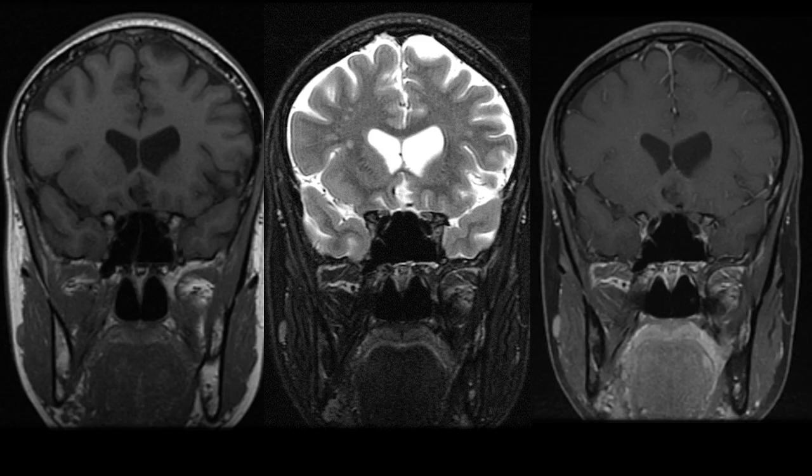MRI is helpful for characterizing the surrounding intracranial compartment and the relationship of the sphenoid to the surrounding brain and overlying critical neurovascular structures. The anterior clinoid process with its fatty marrow can be well imaged with MRI and can serve as a landmark to help locate the optic nerve, which sits directly medial to the anterior clinoid processes.